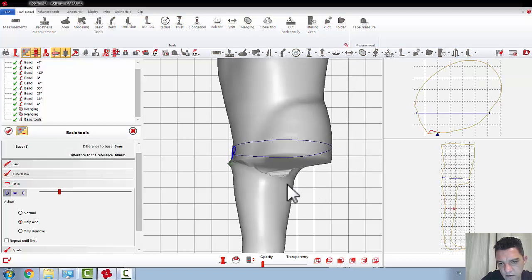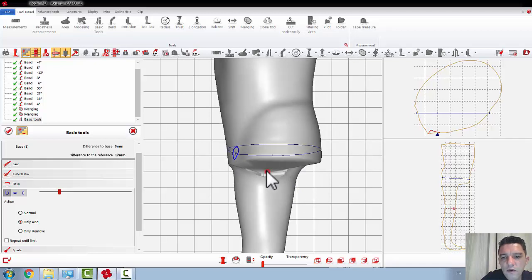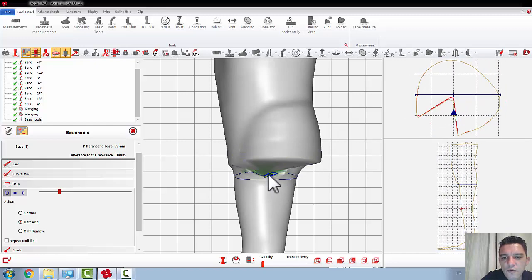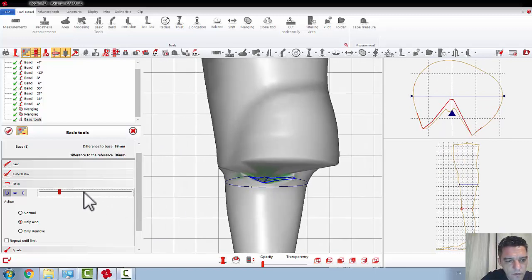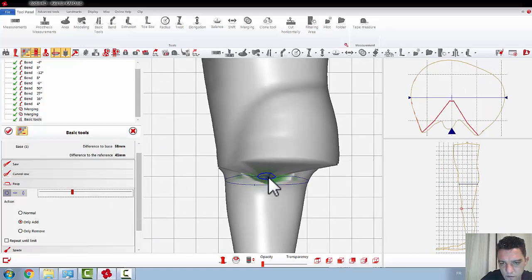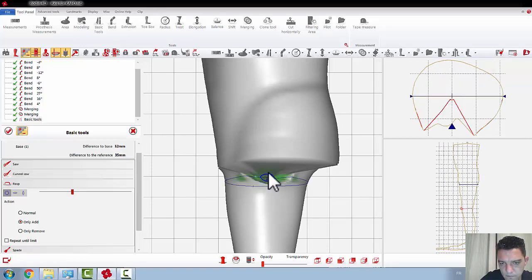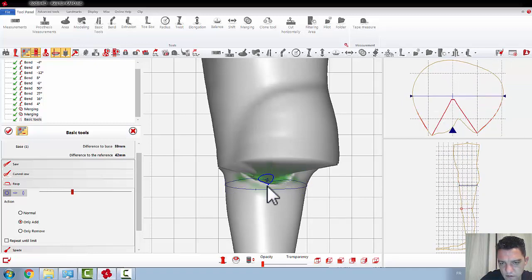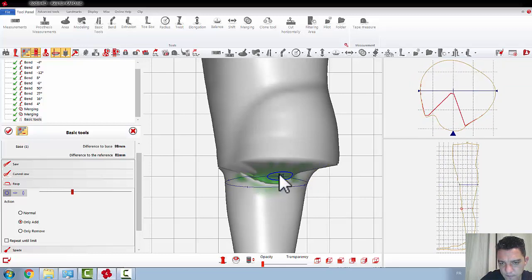For example, here you can, this is not important for me because I hope I have the reference, but anyway, you can, if you want, you can add material to leave. Probably if I increase more, I am adding more material. Okay.